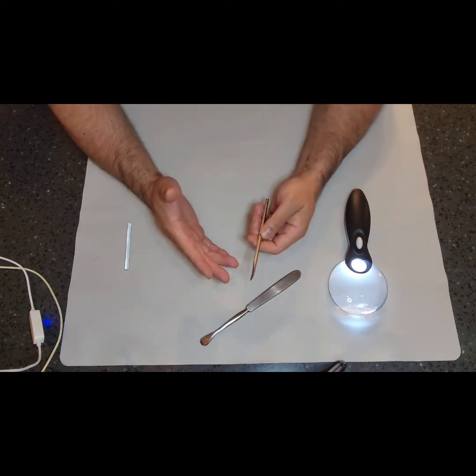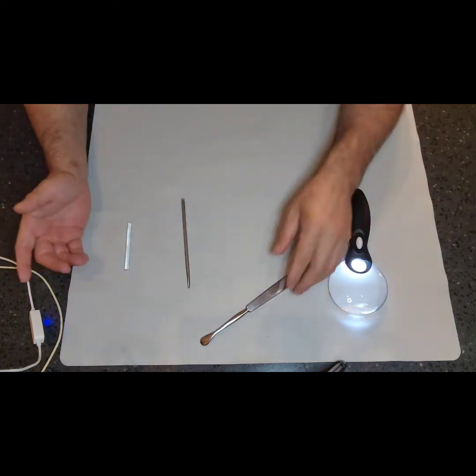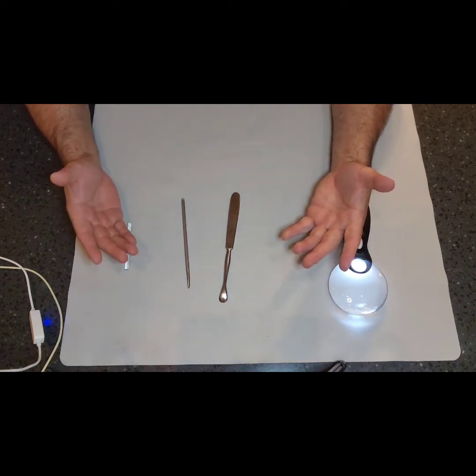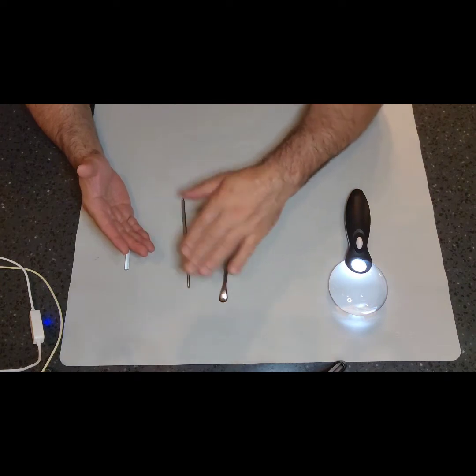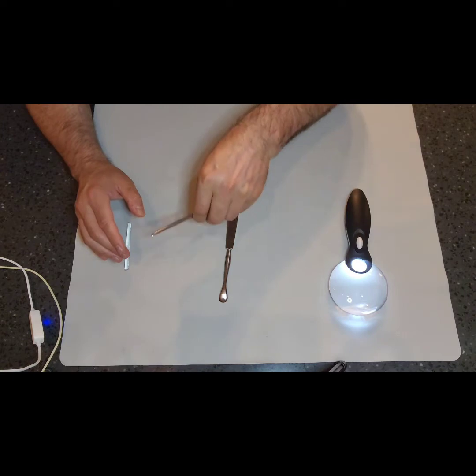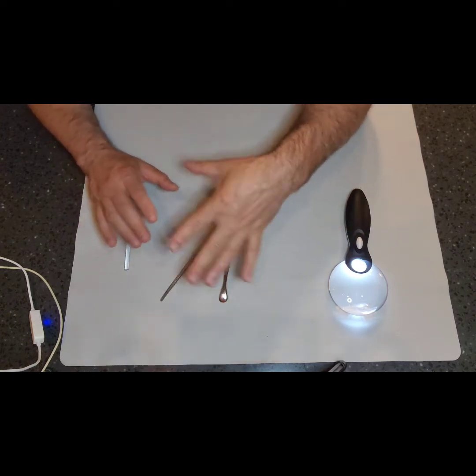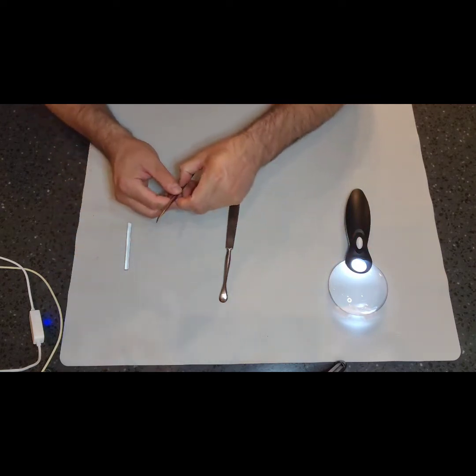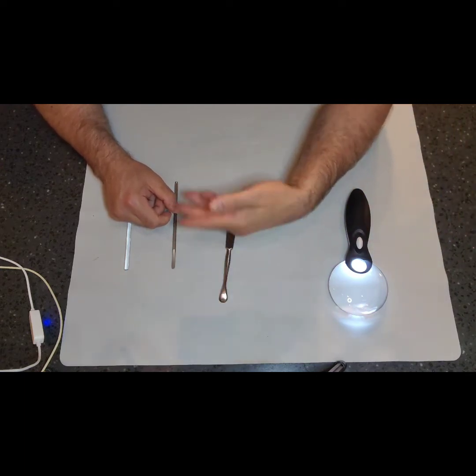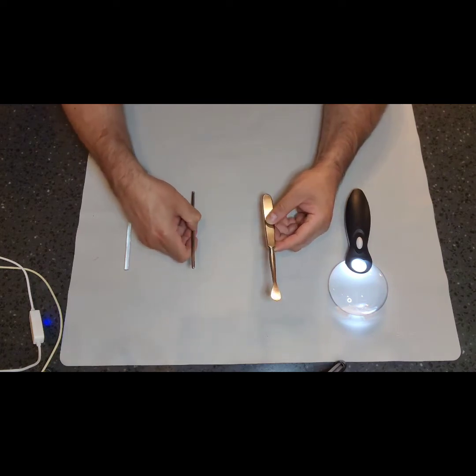The same thing with skin. If you think about making a pocket, think about turkeys. That's my famous thing that I do when I roast a turkey: I dissect or undermine the skin. I don't remove the skin all the way, but I make a pocket under there. I'm actually dissecting the skin off the muscle so I can create a pocket and put some butter in there, and so forth. Now, I don't use surgical tools to do that, but I use my finger or a knife to get under there. All right, that's what elevators and dissectors do.